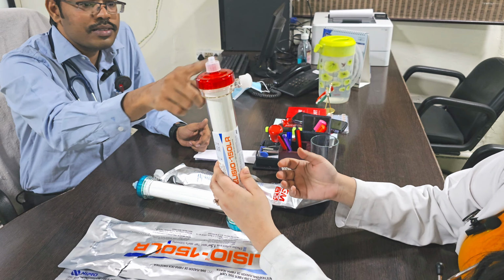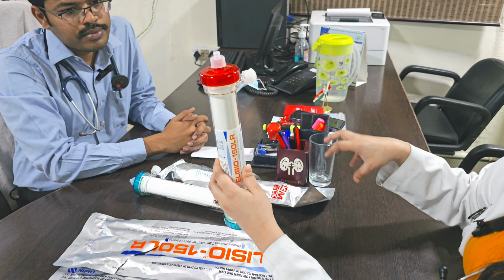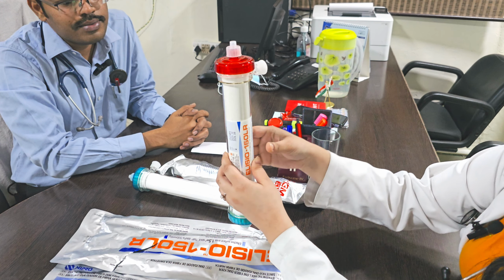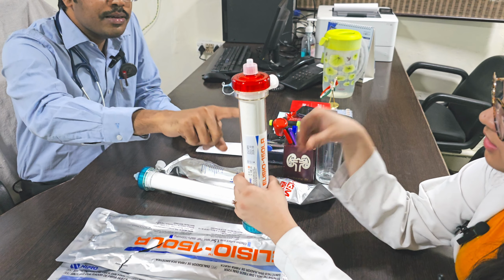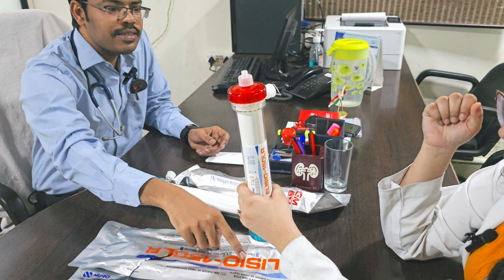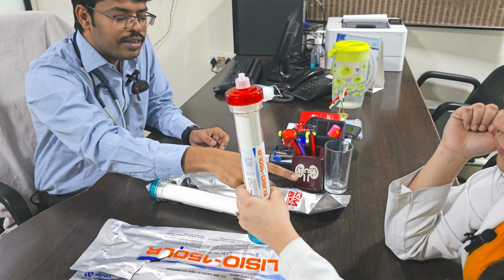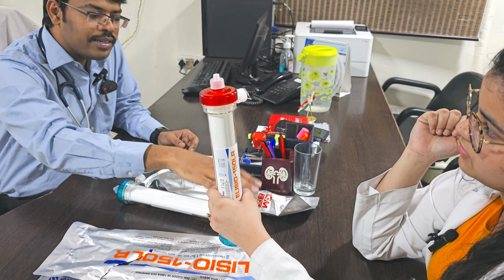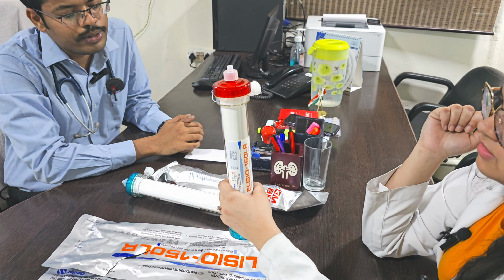Okay. In counter current, the dialysate will enter from this port and will exit from this port. So this is the hollow. For example, the blood always comes in this direction, enters and exits. The dialysate can come in this direction also, which is called co-current. If the dialysate fluid, or the water for your understanding, goes in the opposite direction, it is counter current.